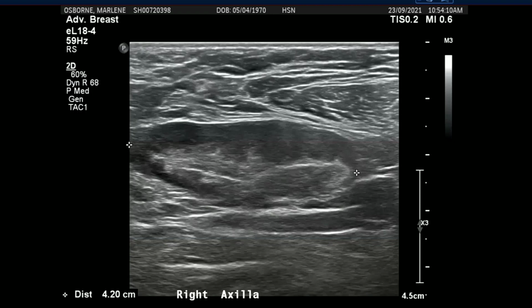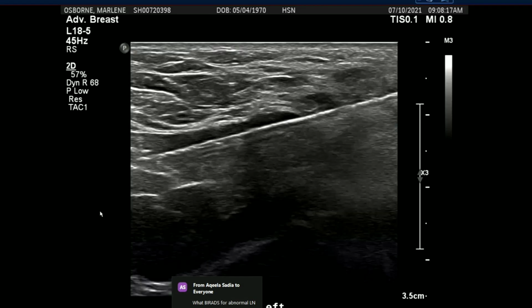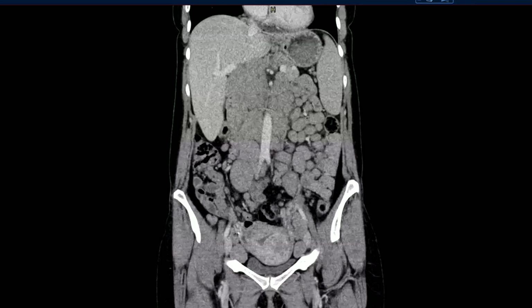So they should be, okay. So then we biopsied them. That's the biopsy, right? We biopsied them and then they turned out to be, what is this diagnosis? Lymphoma, right? See all those lymph nodes? See all those? That's all lymph nodes. So this is lymphoma. Now what do you do to this?